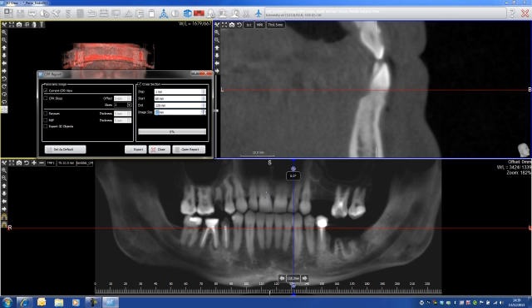The image size of 40 millimeters is actually the width of the image. Well, I can increase it if I like to, let's say 50. On the other side, if it's ticked here, it means that we're going to have this standard panoramic view. If I want to have more panoramic, I can tick here, select 5, 7 or 9. For now, let's do just 3. RaySum and MIP are only filtering to increase contrast and luminosity. We won't use them for now.